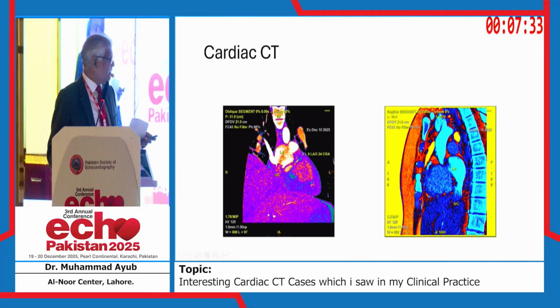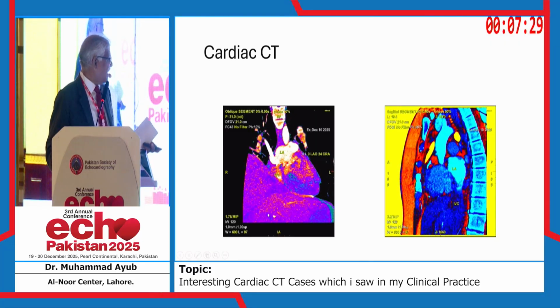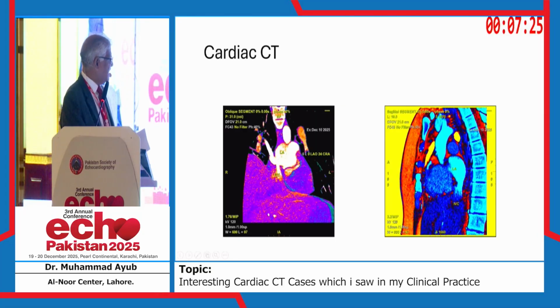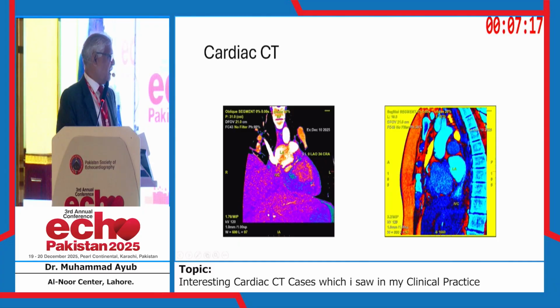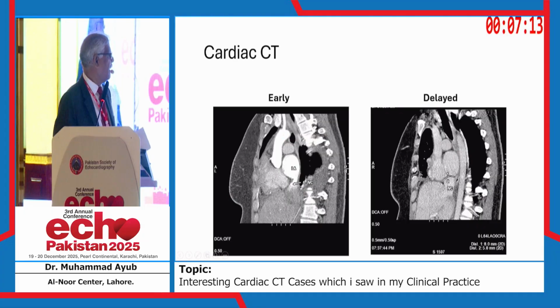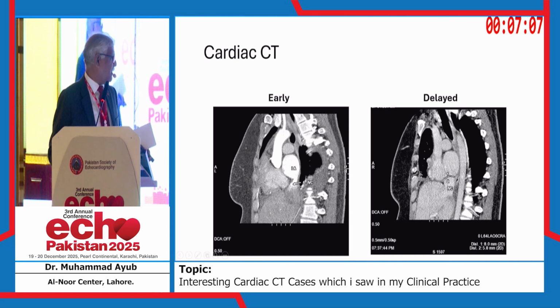But to confirm that, a cardiac CT was performed, and that confirmed the diagnosis that this IVC is directly going to the LA, and it is giving deoxygenated blood to the LA and to the systemic circulation. Yes, it was missed preoperatively. Again, the CT images.